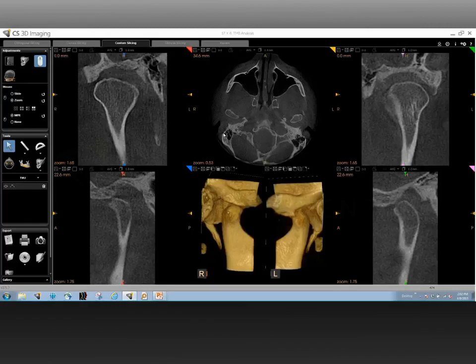Let us start with the condyle first. So this would be the lateral pole of the condyle. When you look at the anterior-posterior view, the lateral pole is the outside edge of the condylar head. Let me just do this real quick. What you see over here where my cursor goes, that's the outside edge of the condylar head, and that is the lateral pole. And the inside edge is the medial pole. And the same applies for the contralateral side as well. You notice that is the lateral pole, and the medial pole comes in the medial edge of it.